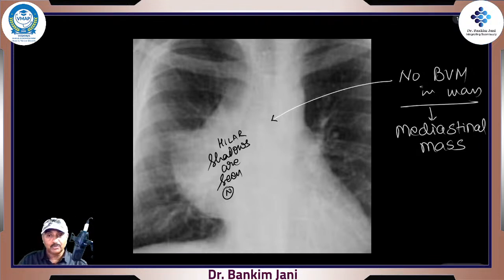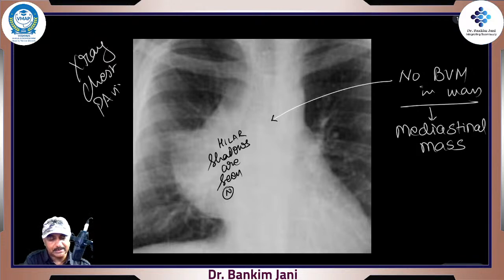What will you do? Right now the best is to go for a CT scan. Just one cut and done. You are through with the diagnosis. So this is our X-ray chest, and we always take a PA view because that also tells us this. Got it?